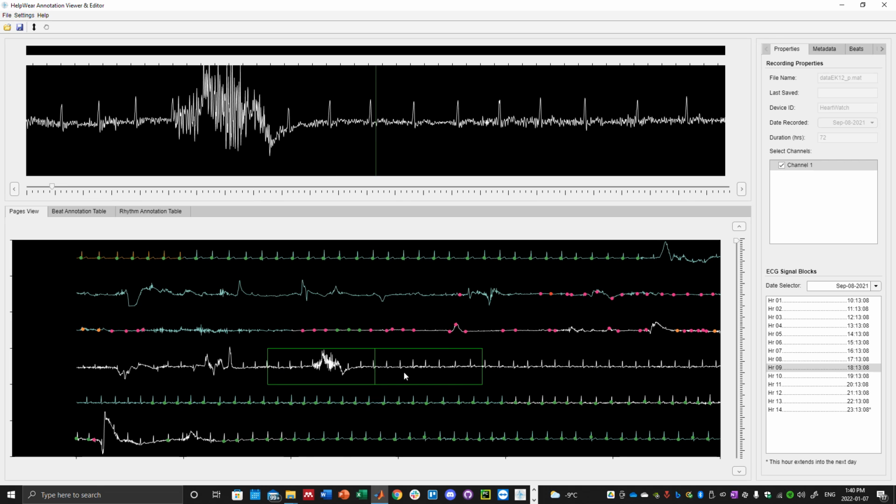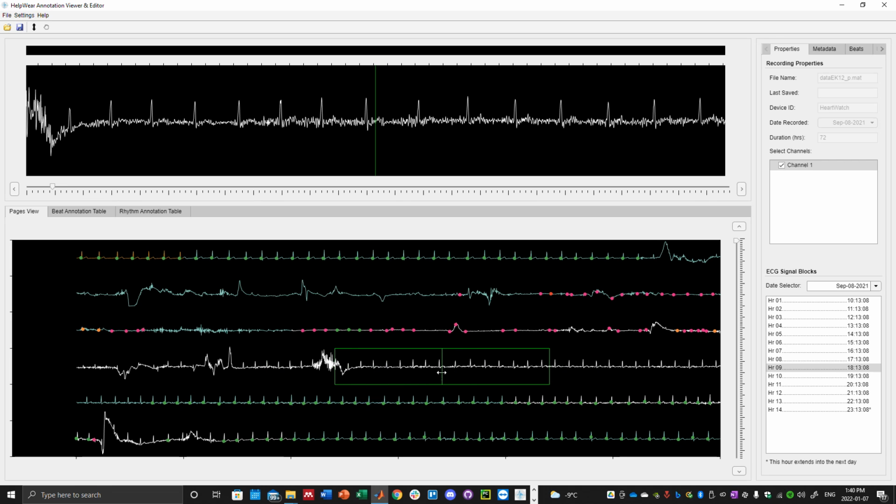With the ROI, we're going to select a specific region to start from. We are going to start the rhythm annotation starting right over here. What we're going to do is get the cursor, put it in the strip axis, and right click with your mouse. We're going to go to rhythm, and you have two options here: onset and offset. Onset, when selected, is where the rhythm annotation is going to begin, and offset is selected where we want the rhythm annotation to end.